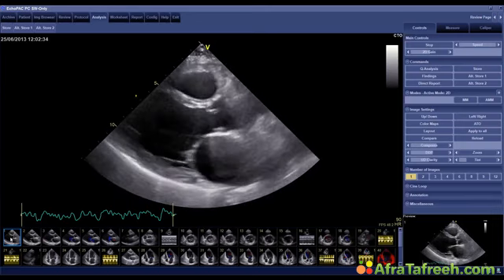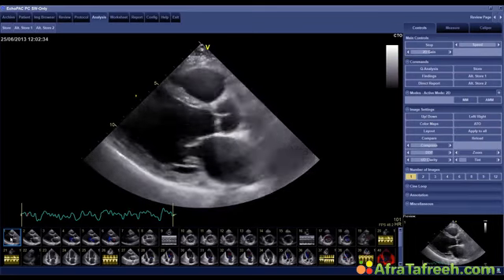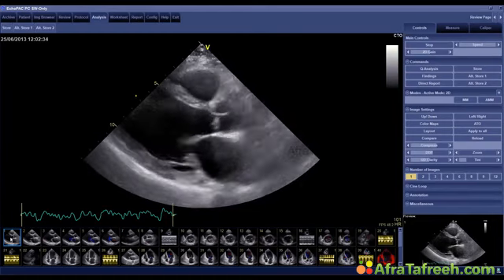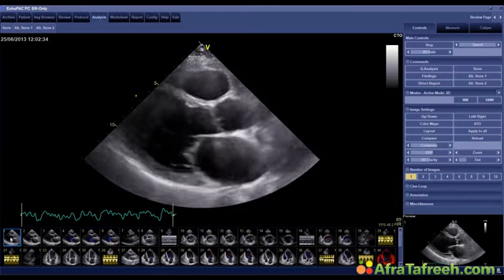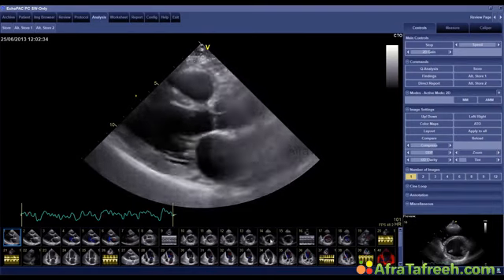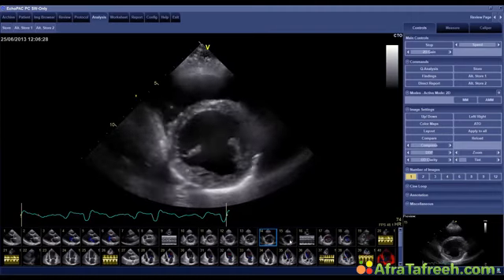Now I'll give you my conclusion and my little notes on how I see this study. Well, the first interesting thing is that the patient has very poor left ventricular function. So he has cardiomyopathy, and the question always is, why does someone have cardiomyopathy? Remember, in many cases we do not know, but in this case the patient had a special form of treatment for multiple sclerosis, which is Novantrone.